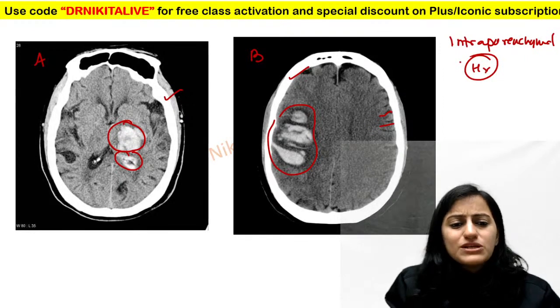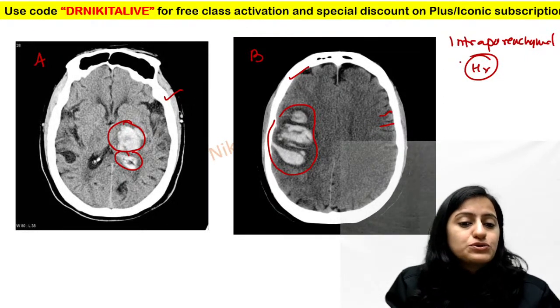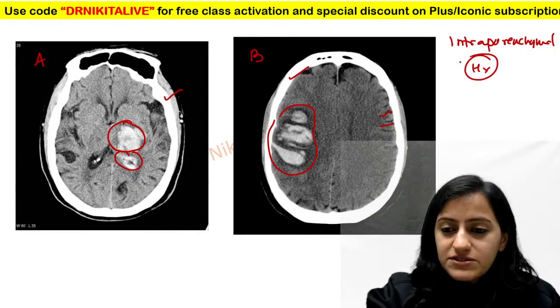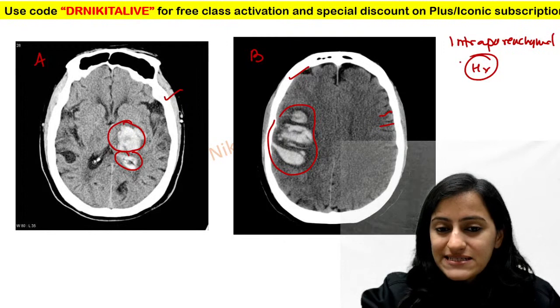If I ask you which of these images, A or B, do you think is because of hypertension? Which of these do you think is because of hypertension? Is it A or is it B?